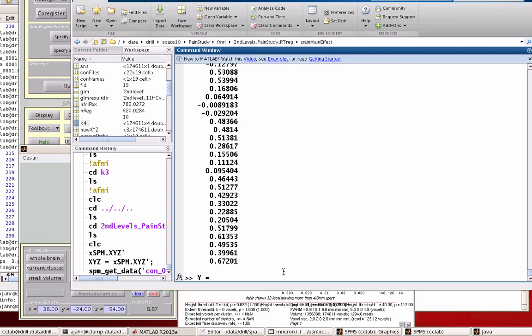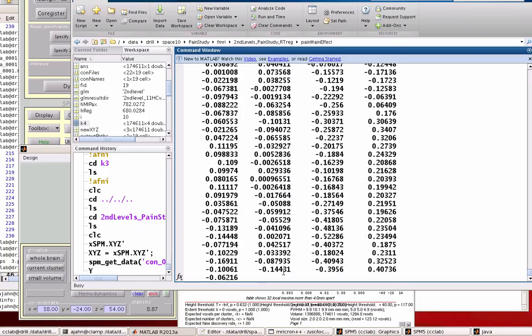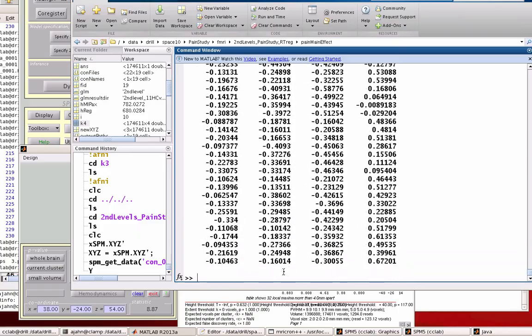I might get a variable called Y, and let's say there's pain, incongruency effects, pain prediction error, and stroke prediction error, and I concatenate all those together to get this 4-column matrix right here. Again, each row is a single voxel. So in the next tutorial, we'll be talking more about running the actual k-means analysis and then putting that into an image.